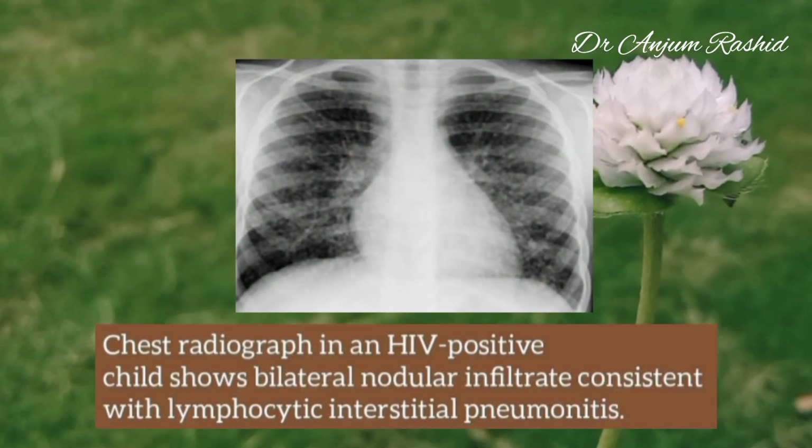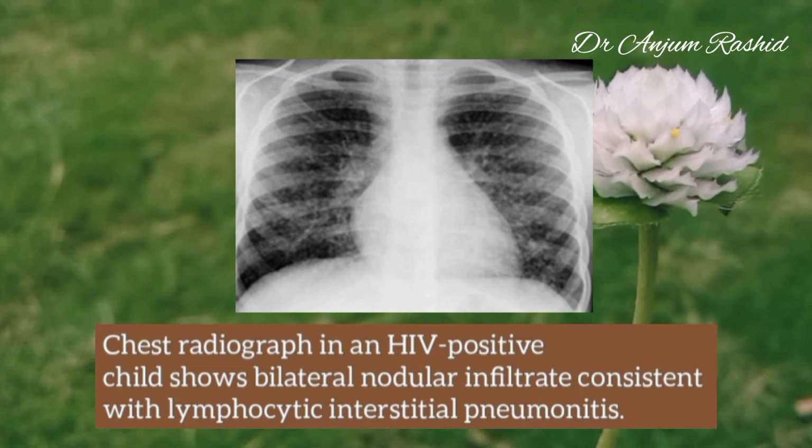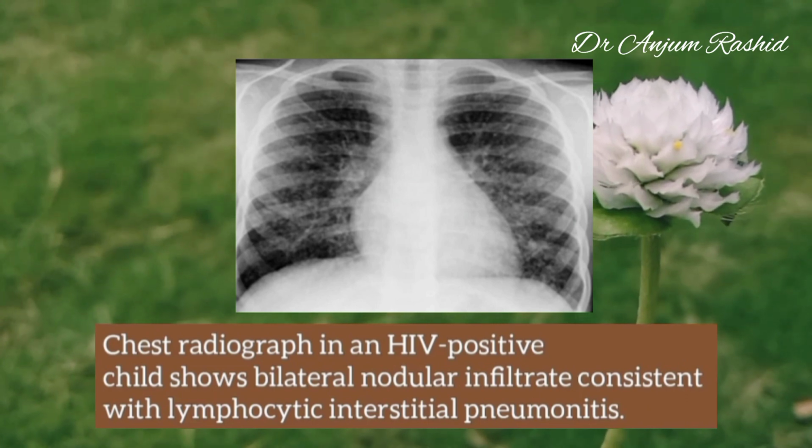Now, next is a chest radiograph in an HIV positive child. It shows bilateral nodular infiltrate, and this is consistent with lymphocytic interstitial pneumonitis.